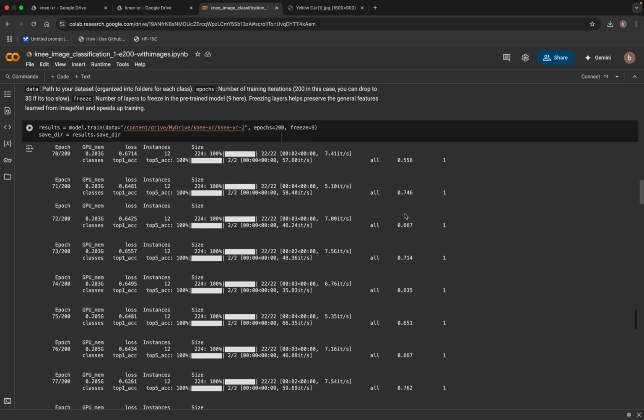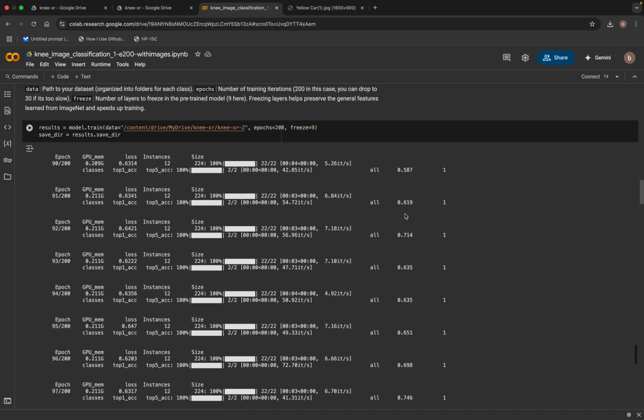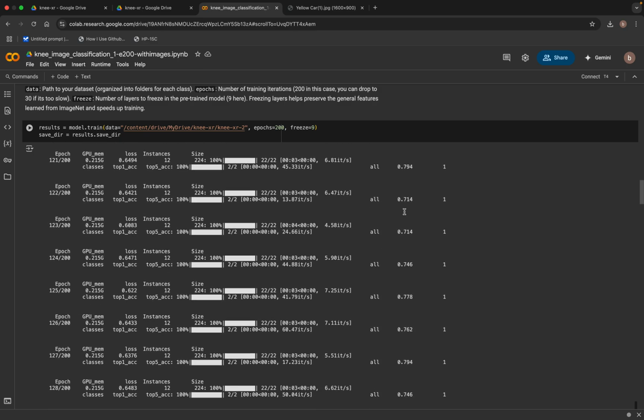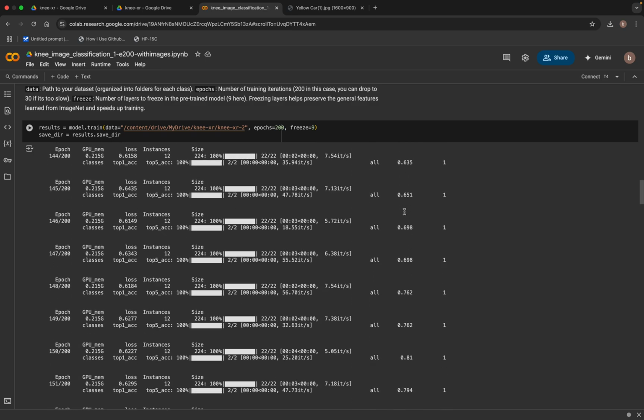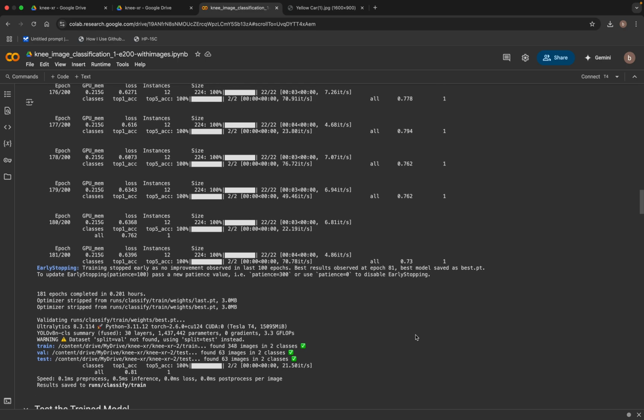And the losses also should be improving too. We'll go through that. If you go all the way down here, it looks like the accuracy is getting better, but it's still not that great, but it's okay. I think let's see what it does at the very end. I think it stops down here. It looks like we're getting 0.76. I have some images of that.